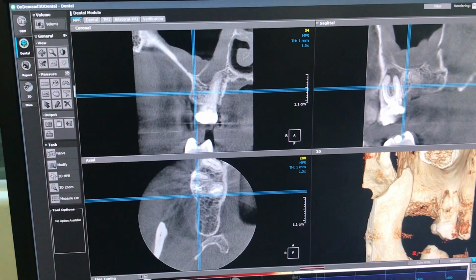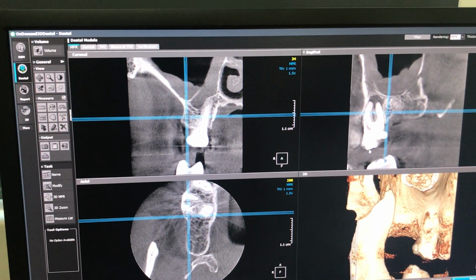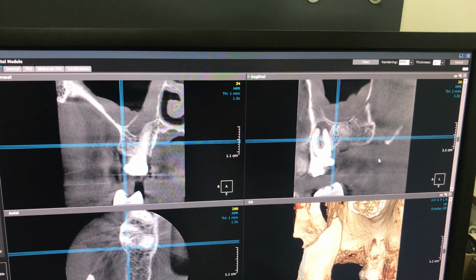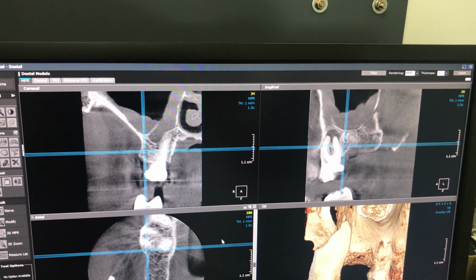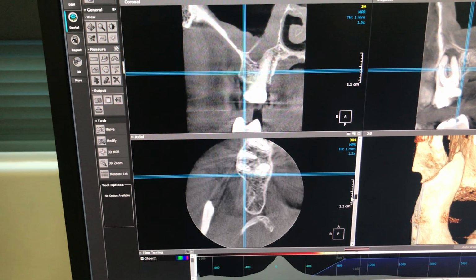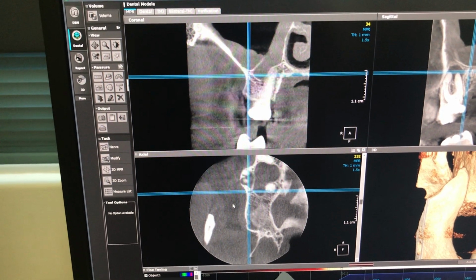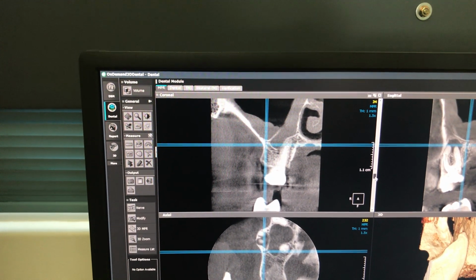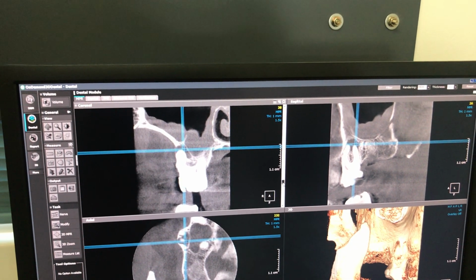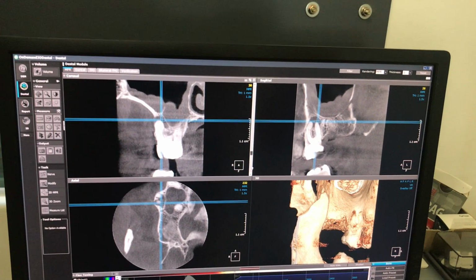So I'll make this down to a small size and look at the multi-plane combination here. I'm looking at, in the sagittal view, the severity of this abscess is quite clear. It's amazing, isn't it? Yeah, it's a very clear picture. If I go up and down on the axial view here, you'll see the abscess virtually taking out the buccal wall of these teeth, and even in the coronal view here, you can see, bringing it into perspective, the size of this abscess. It's actually engaging into both roots. The prognosis is basically zero for this tooth. Yeah, so I just thought it was a very clear image.